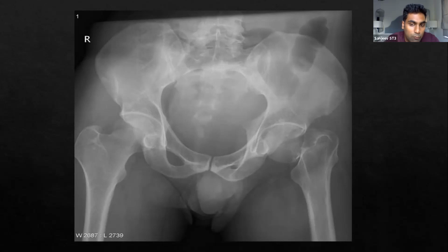And before that, radiologically, would you do anything else? Oh, I would like to have a lateral X-ray as well. Fantastic. Very good. So that's right. Most intracapsular fractures, as you correctly said, depending on their life expectancy and their fitness, can be considered either for a THR or a hemiarthroplasty. I don't think you've missed anything else out there. So that's very good. Thank you, Aaron.